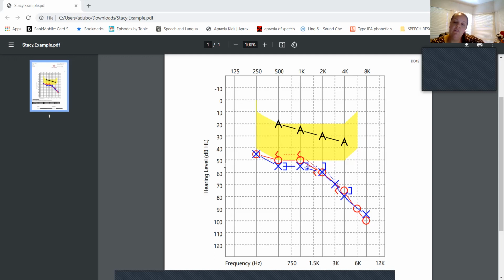And then 55 decibels is like what I'm talking to you at right now. It's conversational speech. And then we get up to 80, 90, 100 decibels. Think a lawnmower, very loud sound. 120 decibels, think of an airplane going off. So it's just taking off, just really, really loud.